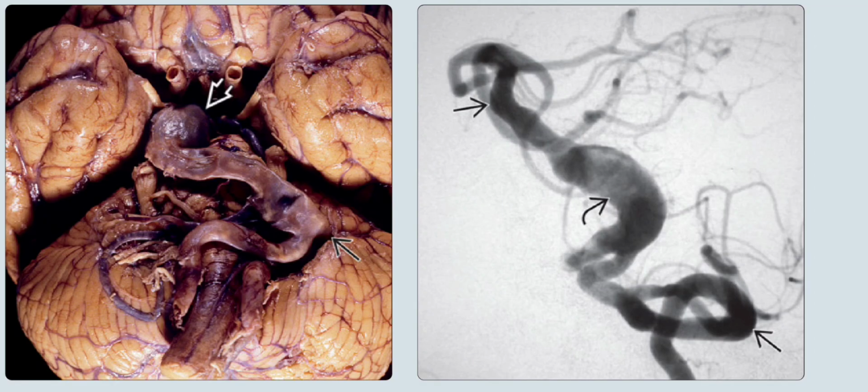Left is again an autopsy image, and it shows a very tortuous vertebrobasilar artery with an atherosclerotic fusiform aneurysm that extends from the vertebral artery junction to the distal basilar bifurcation. Right is the oblique DSA image in the same patient 2 years later, and it shows the dolichoectasia of the proximal and distal vertebral arteries. A fusiform ASVD aneurysm lies between the arterial ectasias. The residual lumen is indicated with the arrow, and the aneurysm had enlarged but also partially thrombosed, leading to mild TIAs.